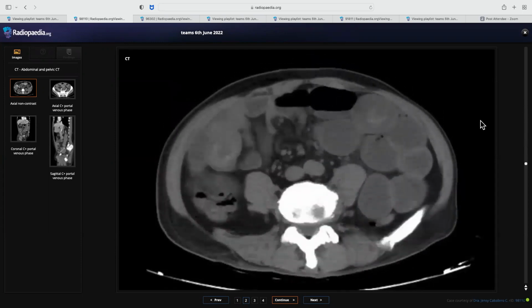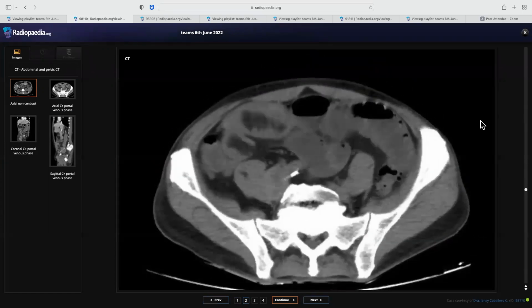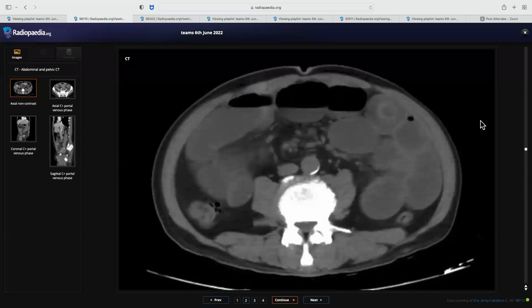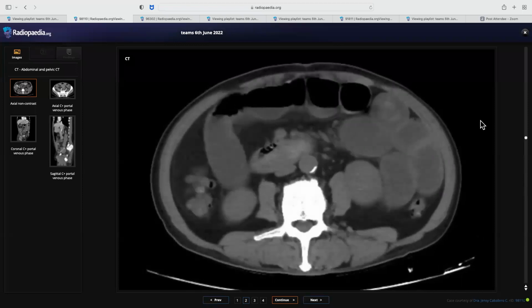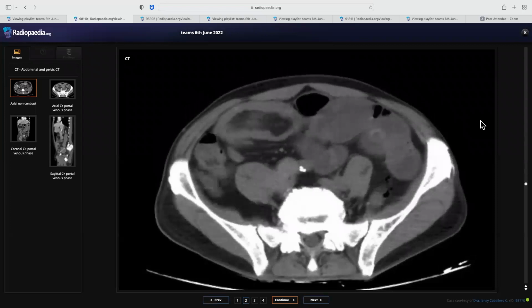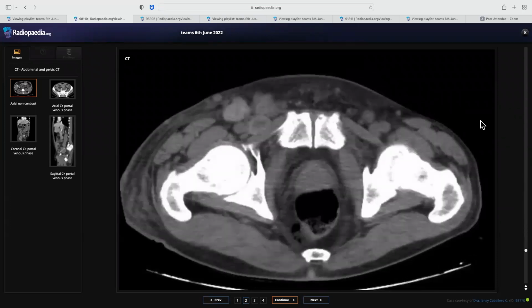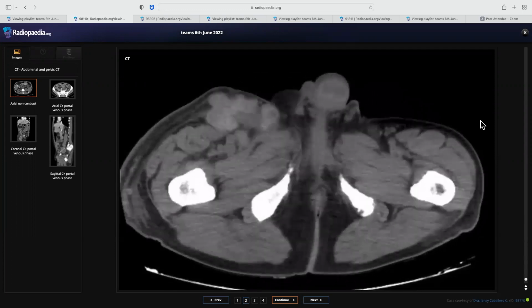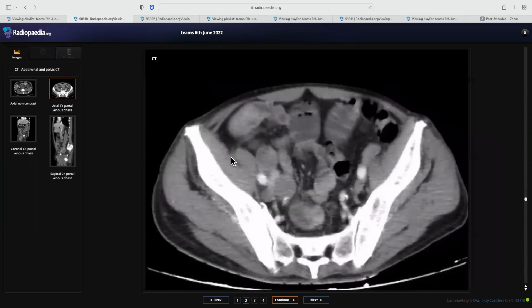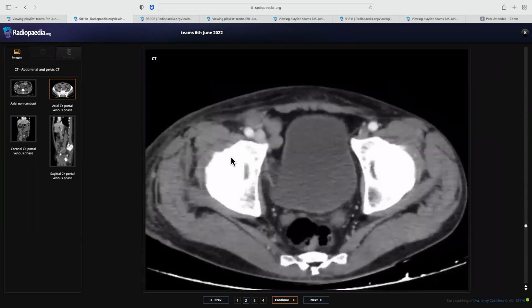So I'm providing with the unenhanced CT scan abdomen of the same patient, which is confirming the small bowel obstruction. There is a mass showing hyperdensity within it, seen within the small bowel. It's invaginating. There is a loop of the bowel invaginating within the adjacent bowel loop, and this mass is probably acting as a lead point, and it's exhibiting ilio-ileal intussusception, and it's causing a transition point there with proximal upstream dilatation.